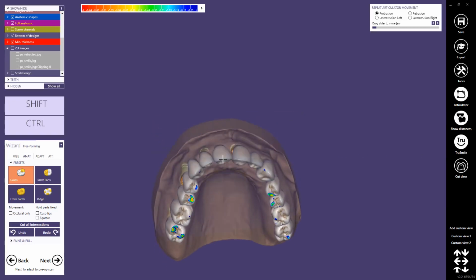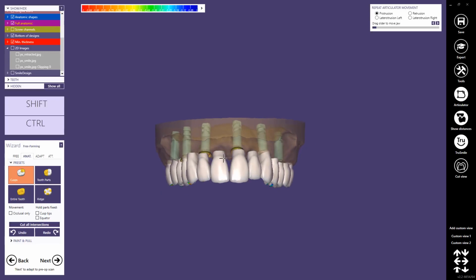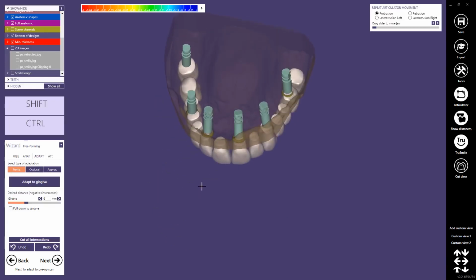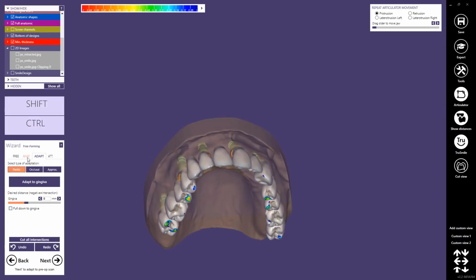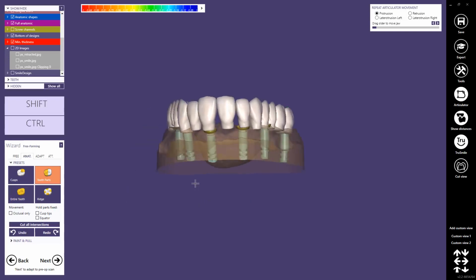Okay, I recommend not to do too much freeform. As I already explained, this will not be taken into account when calculating the thimble crowns. But in any case, I will adapt all the intersections, pontics, the occlusal contacts and approximal contacts. Beforehand, I usually still... no, it's not required here.